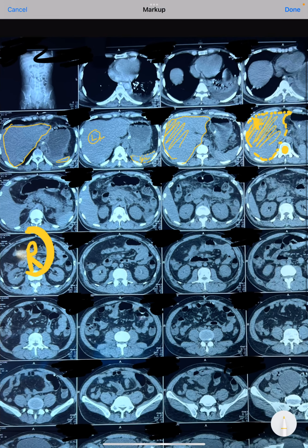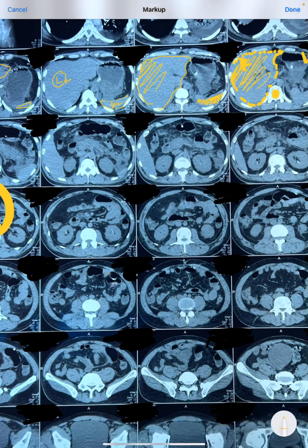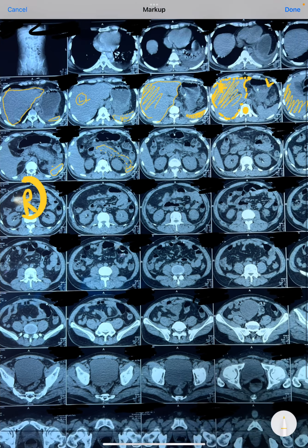Spleen is very important because from the spleen we can trace pancreas. We must know the pancreas tail approaches to spleen's hilum. So you simply need to find the spleen, and if you want to trace the pancreas, you will get pancreas here. So this is all portion of spleen. This is all portion of spleen, and this is here. This is all component of pancreas. So we'll come to pancreas later, but before that, I'll tell other things also which are there.